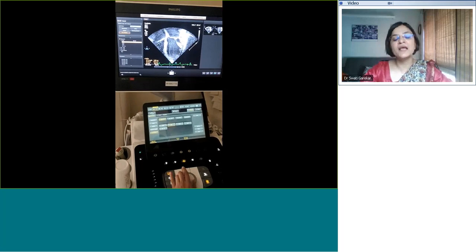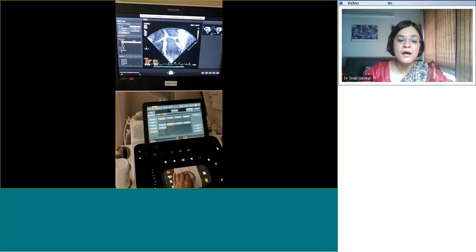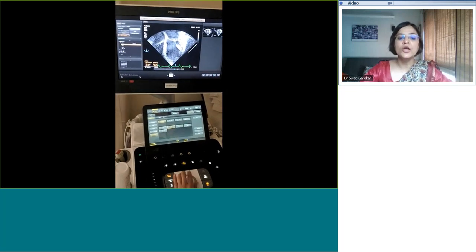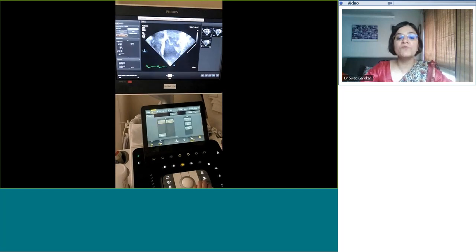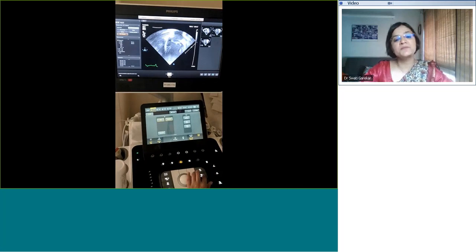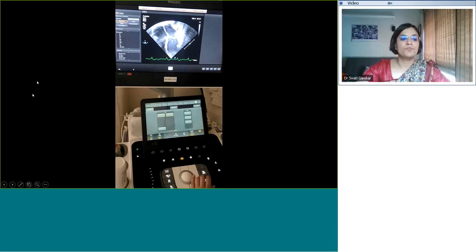Please get in the habit of evaluating end diastolic volume. It is a much better marker of LV size compared to our LVIDD. So you can index it and compare to adult values. You can serially follow up with it. So the next time you have a VSD with LVVO, try looking at the Simpson biplane and the EDV that it generates. I have to pause here.